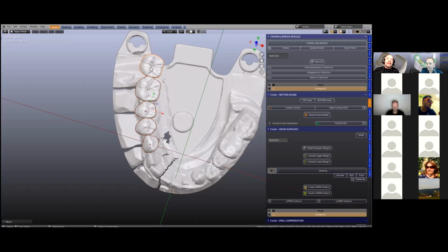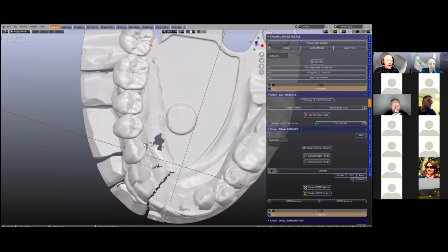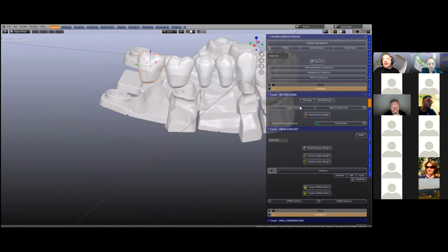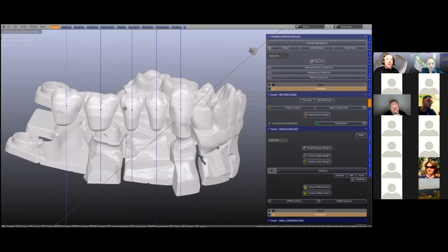So it is sometimes a little bit tricky deciding how we're going to place these teeth, because as you can see, the tooth prep is there, and then we've got another. So sometimes the spacing is quite hard. In this instance, what I've done is I've changed this, and I've used 3 premolars.